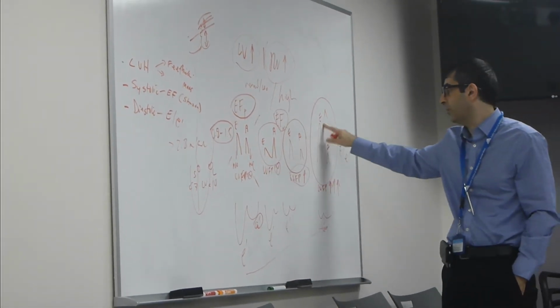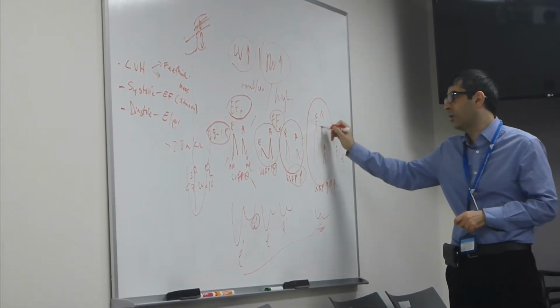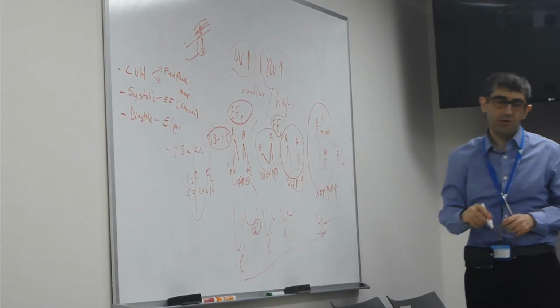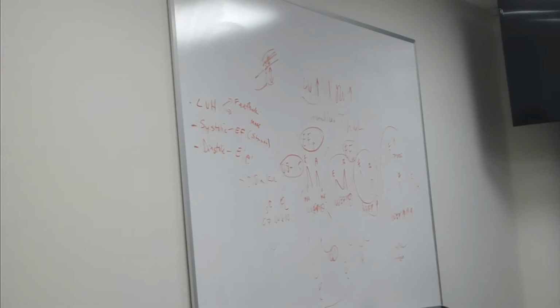If you have this type of filling pattern, high ratio, E velocity is high, especially if it's more than 100 centimeters per second, you can be almost 100% confident that the filling pressures are high.